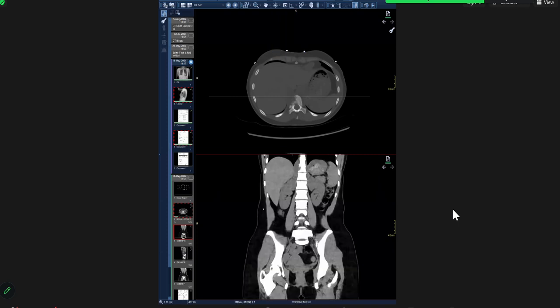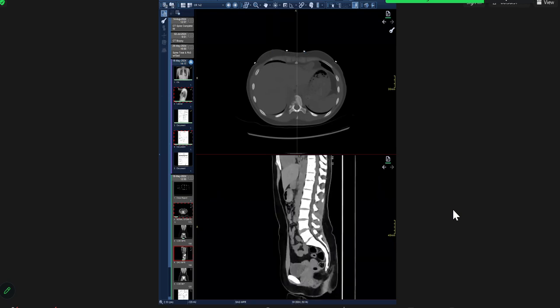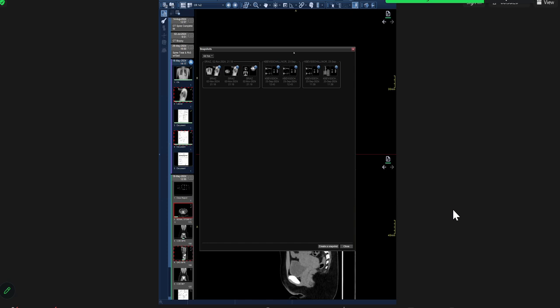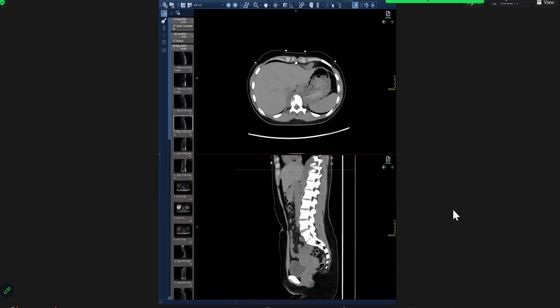In our community, my first differential would include tuberculosis, as the intervertebral disc spaces are normal, and this abnormality is eroding the vertebral body. So my first differential would include tuberculosis, tuberculous spine with paravertebral abscess. So what is your management? What do you want to do next?